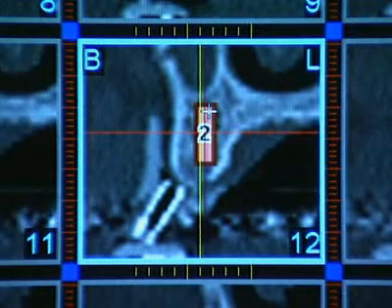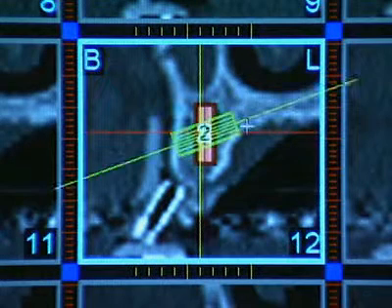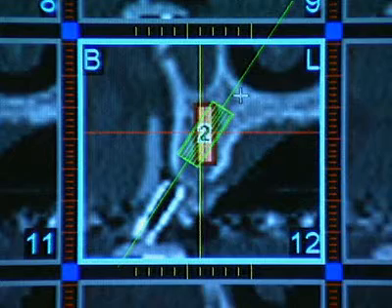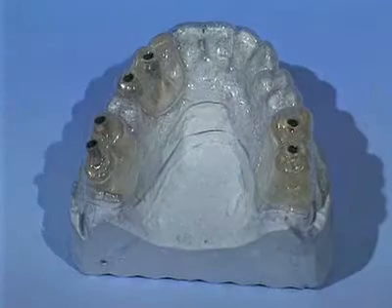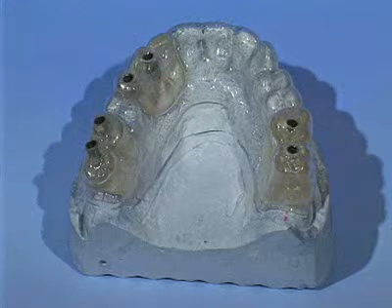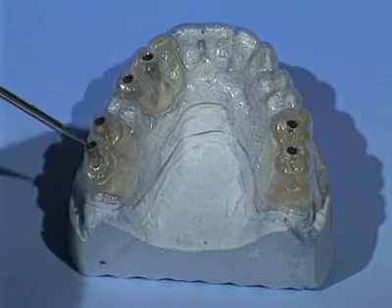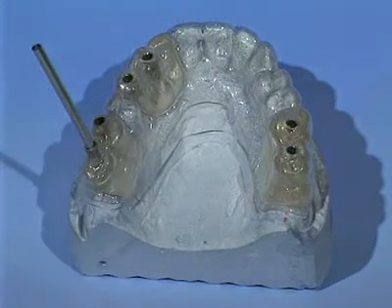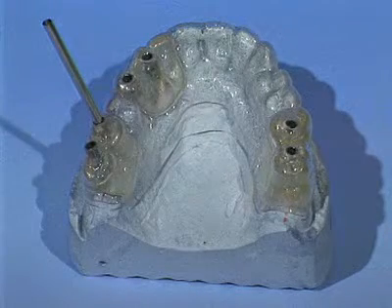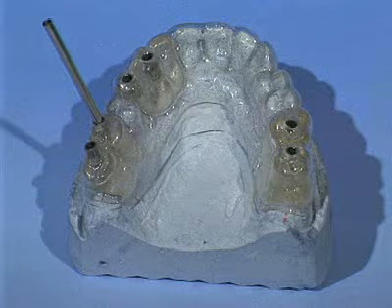Today, surgical procedures can also be planned via interactive software on the PC in the dental office. In this example, the planning was based on inserting hollow titanium cylinders according to the prosthodontic requirements into a thermoplastic template. These titanium cylinders will also serve as drilling aids offering axial guidance later on when the implantation is performed.